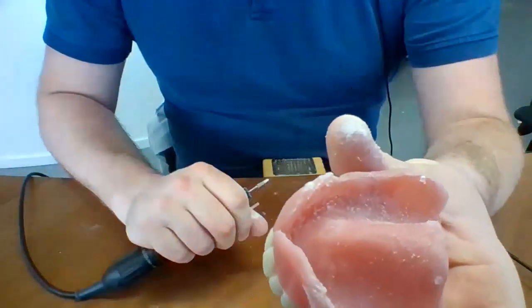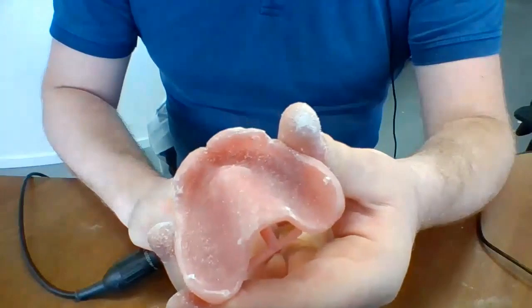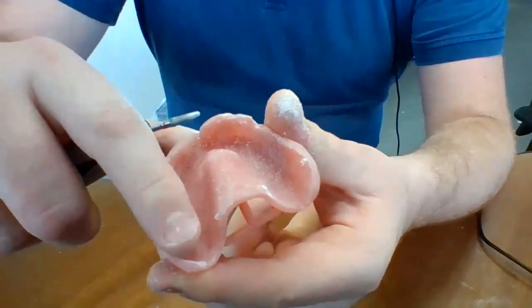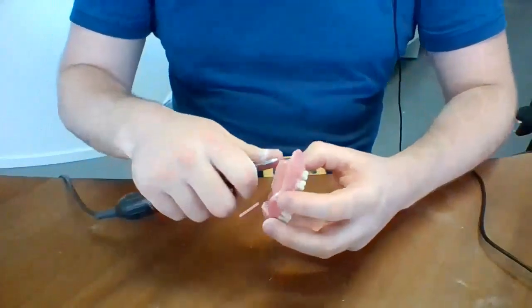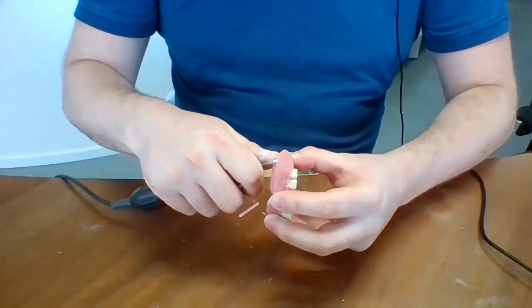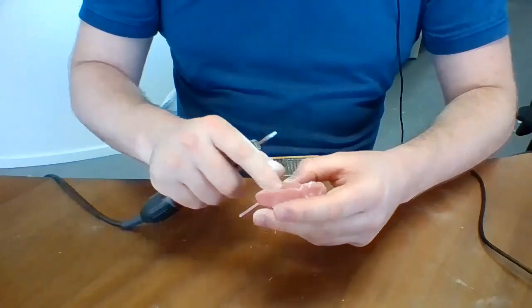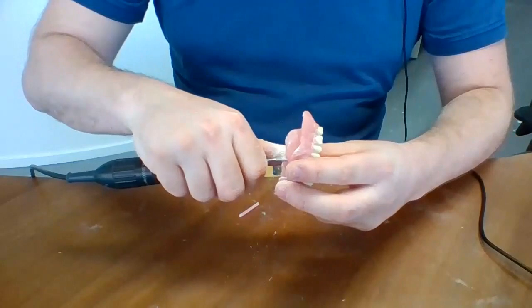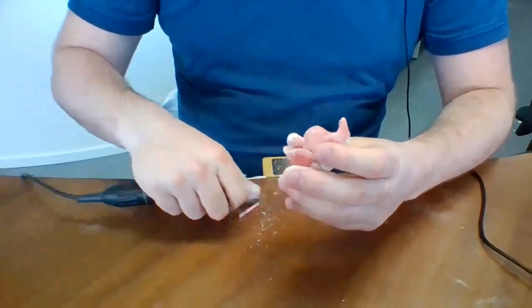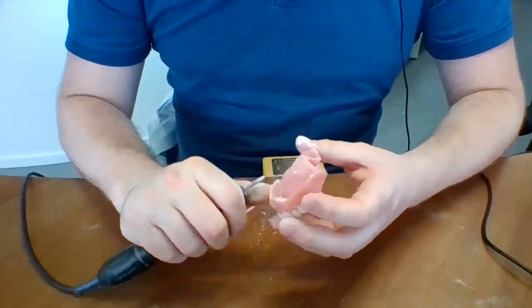So now you have the denture here. So now you see that there are still parts there, and they're quite easy to remove and flatten with your normal hard carbide tool, and doing this and feeling if they're totally gone. Be careful that you don't grind too much away, because you still want that good fit.